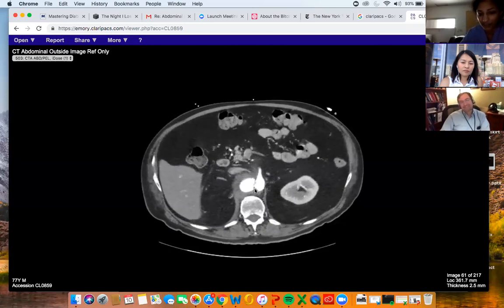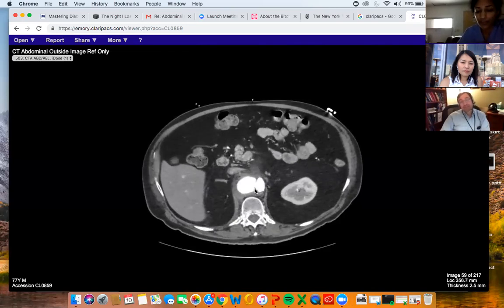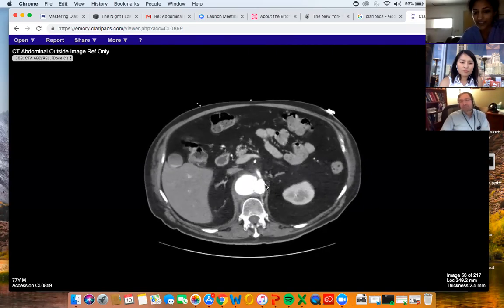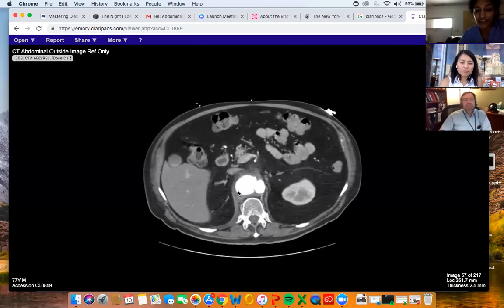So the treatment for this is that traditionally they used to go for surgical intervention. But now they're doing more endovascular repair of these. And so they endovascularly stented across this aneurysm. And actually then they put some stents into the celiac axis and SMA. And then afterwards, we did a CTA to make sure there was no leak here, which I'll show you.